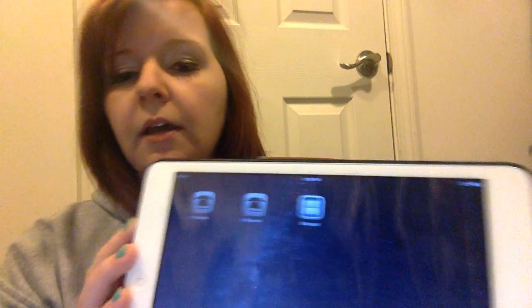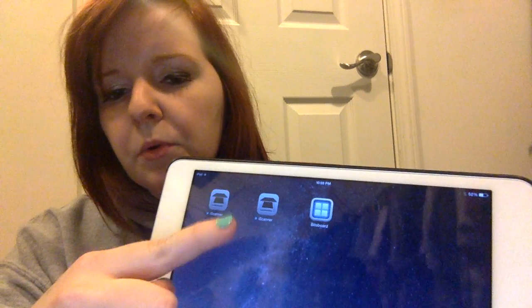But that is Bitsboard. It looks just as Bitsboard, and then it has 4 tiny squares for it. I highly recommend using it for augmentative communication systems, and I look forward to using it more and helping other people learn about it in the future.